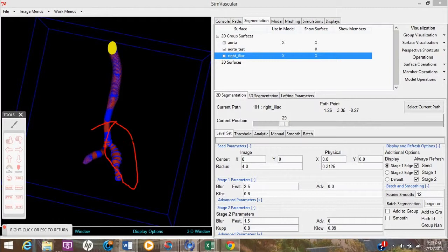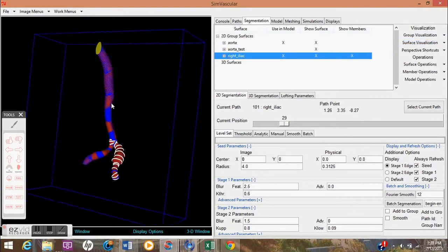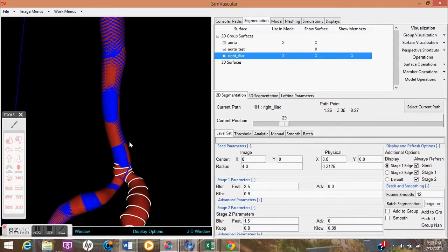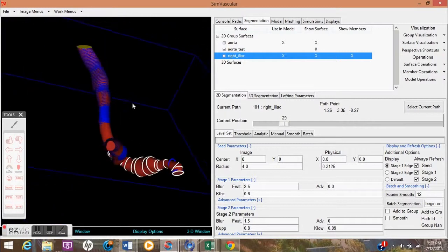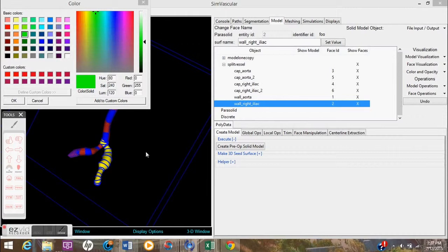And so I'm just showing here, there shouldn't be those contours there, those blue contours. This is another problem I'm having. I'm not sure how to get rid of them. I go do not display groups, display groups. If I display the group, they show up in white. If I don't display it, they're still there in blue, and I'm not exactly sure why. So that's something I've got to figure out. I'll make a tutorial on it later.